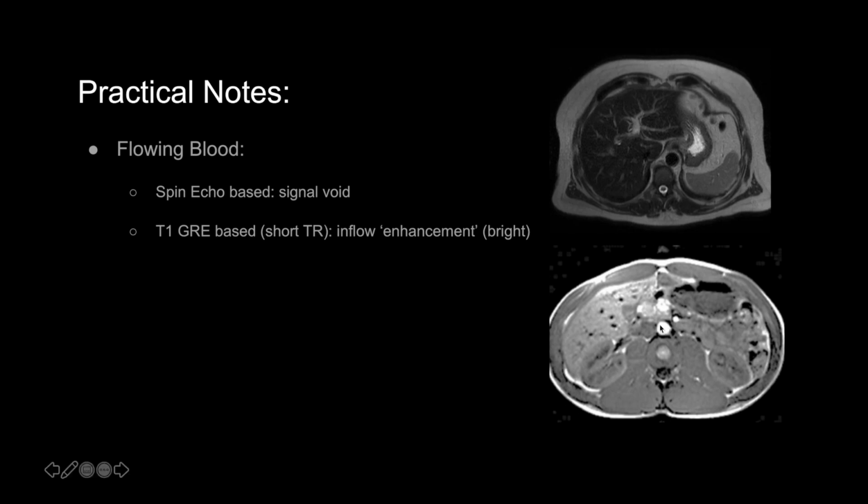If you were to scroll down in this image though, for example, this bright signal would decrease, and you also notice that none of these organs are enhanced. There's no contrast in the kidney.